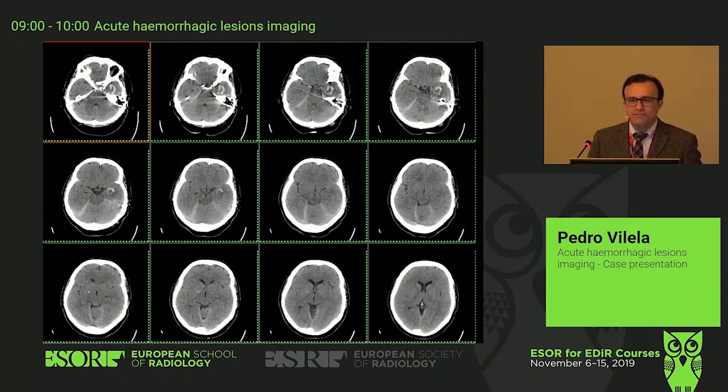Well, do we have a hemorrhage? Yeah, so we have some hemorrhagic lesion here, right? Some edema. It goes well into the surface. I don't like this tentorium. Well, old people may have a thickened tentorium, but this looks like blood here. Okay? Probably not a massive subarachnoid hemorrhage, but something has bled, and if it was an intra-axial bleeding, it would be strange to go to the subdural space.